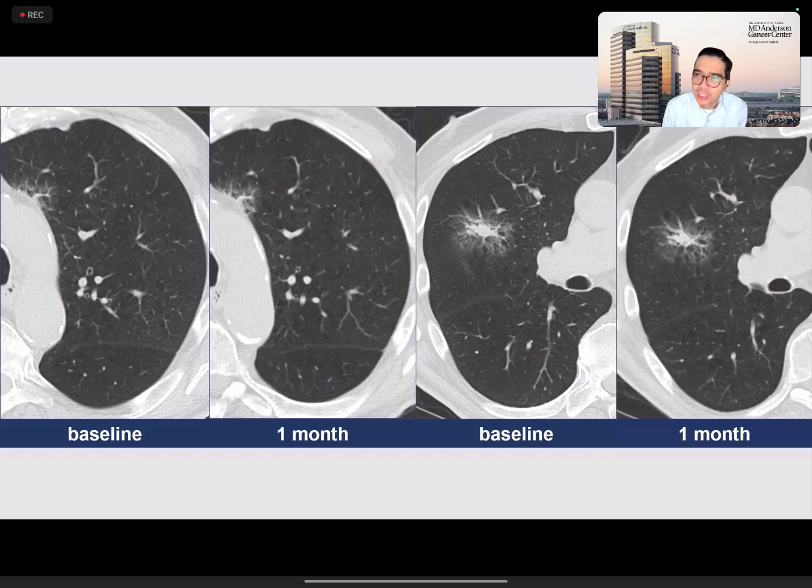So you can have pulmonary lymphoma be primary, and a primary pulmonary lymphoma is when the initial manifestations of lymphoma are in the lung. And then you can have secondary, where it involves multiple areas of the body, and then secondarily involves the lung, either with masses later on, or direct extension from a mediastinal mass. And yeah, you could see, like, it looks like kind of a CT halo sign. So on this baseline, you might be thinking, well, this might be angioinvasive aspergillus, or perhaps it's a primary lung adenocarcinoma. And at 1 month, it didn't change.